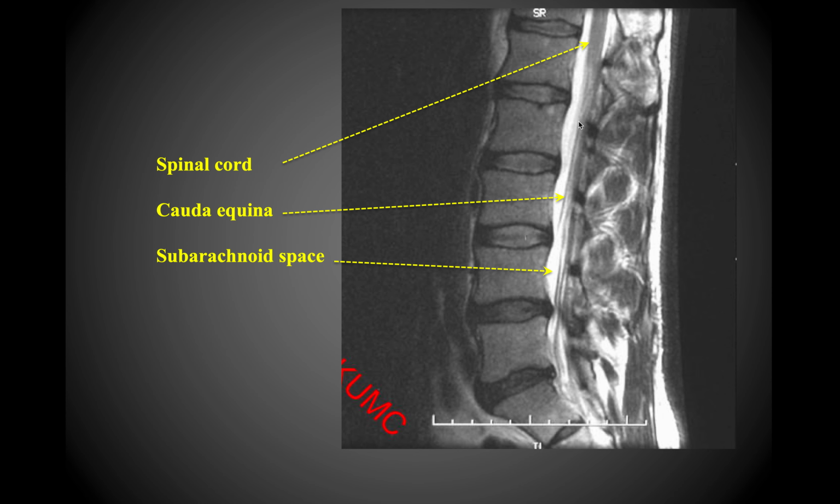And then you can see some of the fibers here comprising the cauda equina. So these are therefore going to represent the motor and sensory nerve roots that are descending from the caudal spinal cord down to the respective intervertebral foramina. And then up here, you can still appreciate the spinal cord is located up here. So remember, that's ending right about the L1 vertebral level in adults.